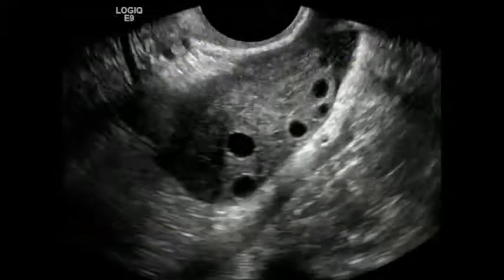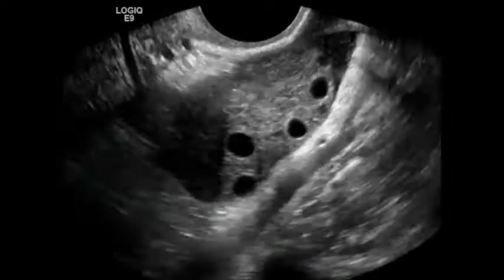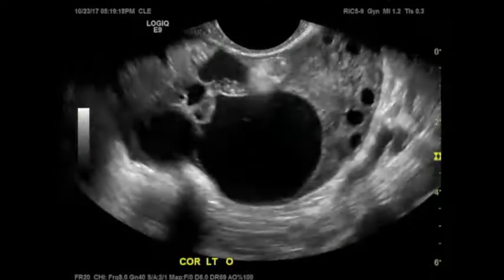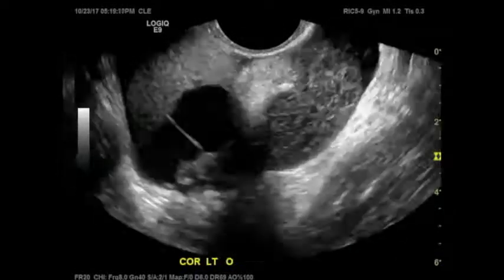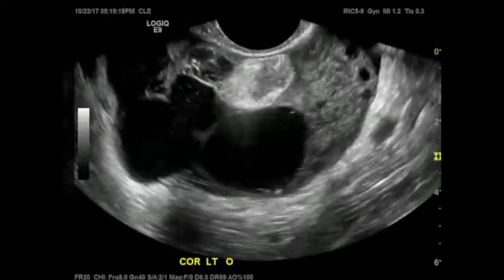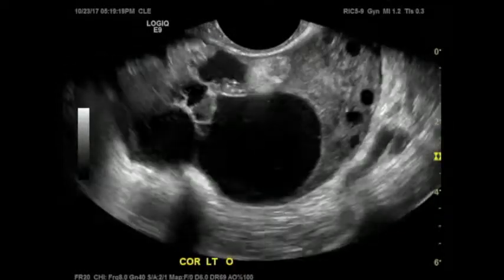This other case, we're a little bit more lucky. You could see the edema, the peripheralized follicles, the twist, and on the next image, you could see the dermoid components. So if you have ovarian stroma, obviously you can evaluate it, and you could see this is most likely torsion, but sometimes you don't have normal stroma and the dermoid has replaced the ovary.